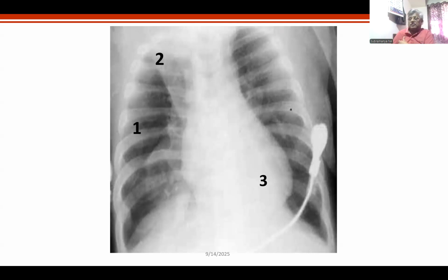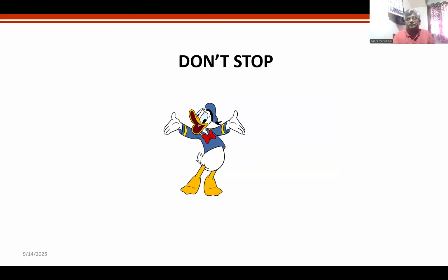Skin can get folded and can give rise to collapse finding. A pinch of skin fold and subcutaneous fat can get folded onto a film when you lie down. You understand? Sometimes they can also give rise to margins like this, but you should be careful. They are often parallel. They don't radiate from the hilum. They're like vertical lines rather than radiating from the hilum. Whenever a margin is traceable to the hilum, it is pathological.